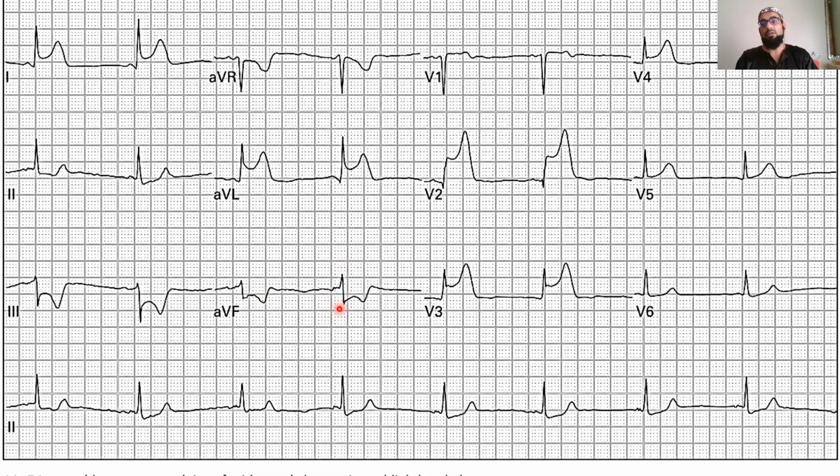Now remember, this is just a simplified way that I'm giving you guys. With AVF running across and now tilting away, the majority of it is tilting away, so we assume that it's starting to go into the left-hand side. To work out exact degrees is a bit more complex, but I don't want to get into that because in our case as emergency, casualty, OPD doctors, that doesn't make much of a difference to us.